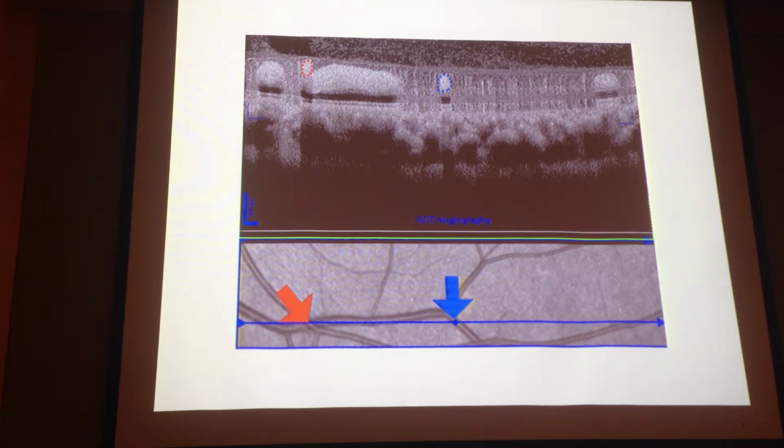In the image presented before, in some paper, the arteries and veins were actually identified in fluorescein angiography, or by looking at color and size, and then going back to the OCT angiography, because you don't see the film, you just get a still frame image.